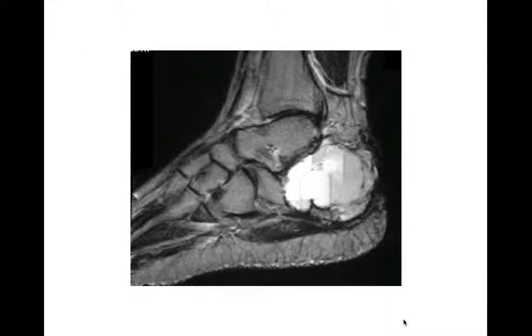This is another example of a giant cell tumor occurring in the posterior portion of the calcaneus. So remember, lesions in the anterior are going to be really your solitary bone cyst or your intraosseous lipoma. Posteriorly, you can get giant cell tumors. The apophysis here of the calcaneus is really an epiphyseal equivalent, so you can have giant cell tumors occurring there. Another fluid level on the MR. Please look at the radiograph first before you make any definitive statements about this, but it's a good location for a giant cell tumor. Could this be an aneurysmal bone cyst? Sure, it could still be an aneurysmal bone cyst in this case as well.